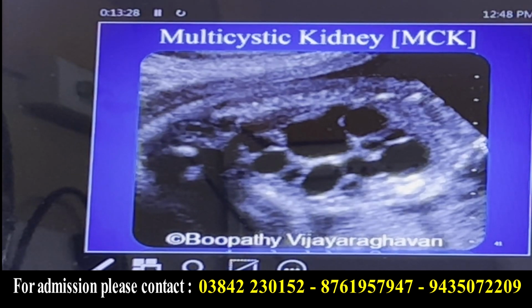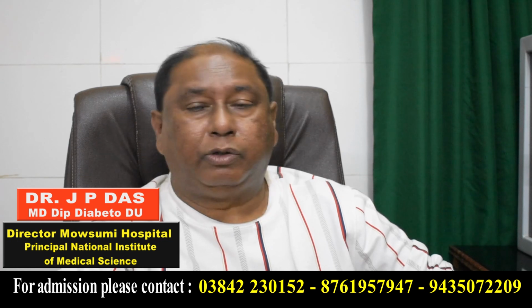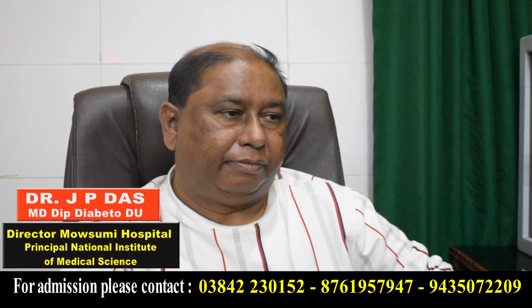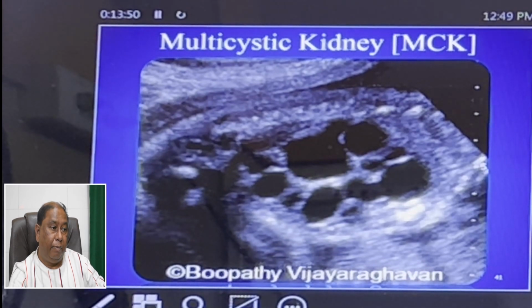What you see in this picture is lots of cysts inside the kidney. This is multicystic kidney. It is usually a unilateral disease. When bilateral, it is incompatible with life. The other side may show an abnormality, most commonly uteropelvic junction obstruction.